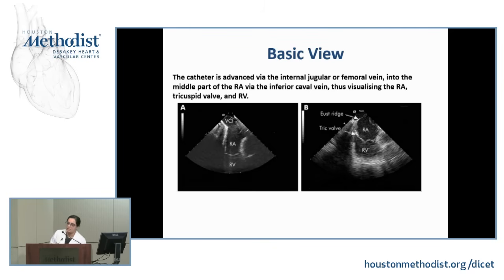Now I'm going to talk about ICE, because we recently published a paper in JACC. It's an imaging vignette type of thing, but we have different images on ICE and how ICE adds a little bit more to the evaluation of LVADs. And we've used it in one or two cases now at Methodist also. So I'm just going to go over some of the basic views.